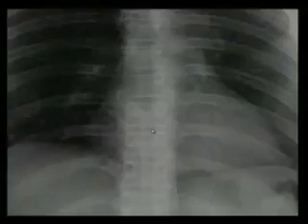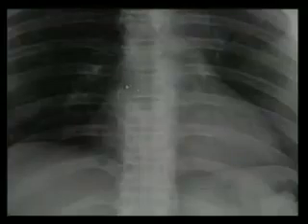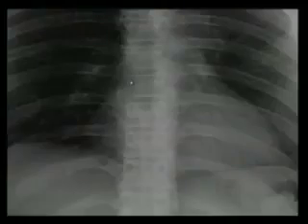Britt Somerville did the same thing. And one day, a couple years after he left, I got a text. He goes, Dr. Gates, your ped worked. He said, because he was working in teaching, if I had not done your ped, I would have missed a missing pedicle. This is a lytic pedicle. The differential for a lytic pedicle would include a lytic metastasis, osteoblastoma, and aneurysmal bone cyst. That's your differential for a lytic pedicle.